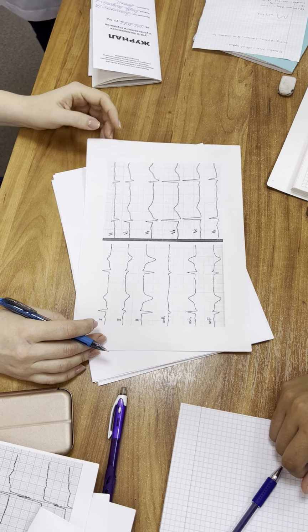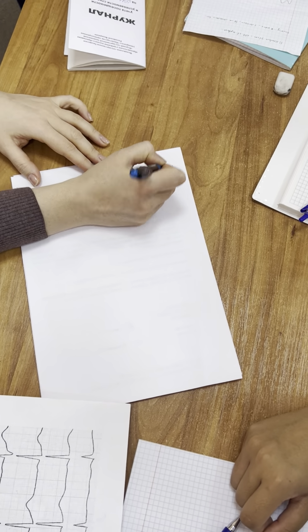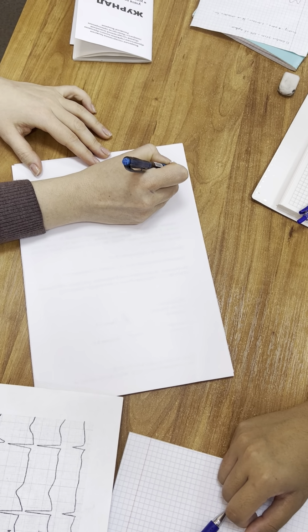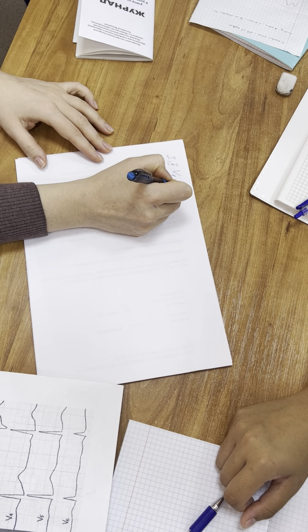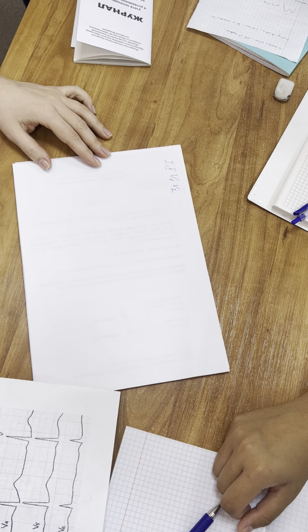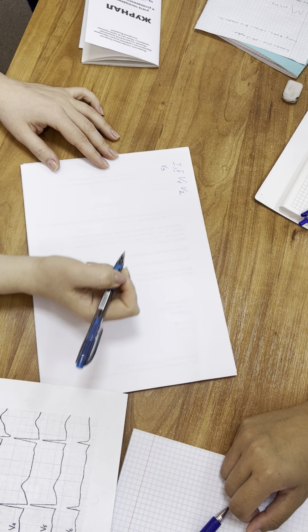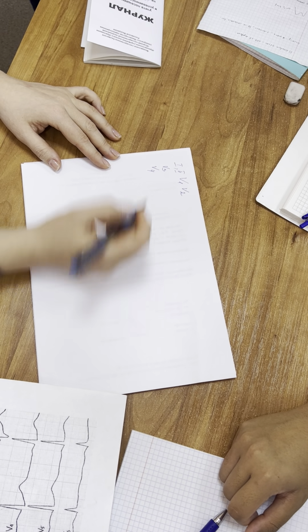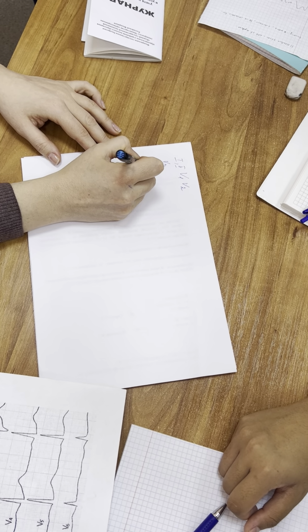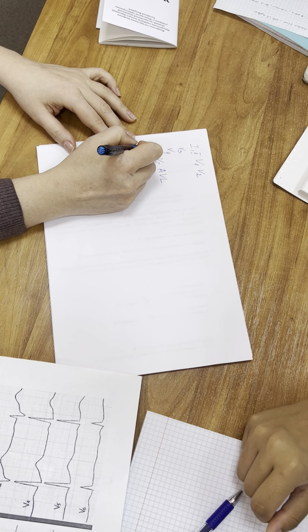Understood? Okay. By location, first standard lead together with second standard lead, V1, V2, anterior wall. Let's go further. V3, V4, V5, V6, AVL. Together, lateral.